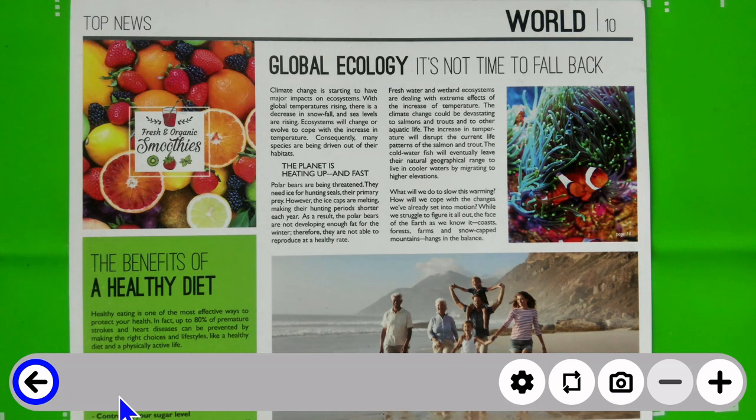Instead of doing that, I'm going to tap an arrow key on my keyboard just so that you can see things moving around on the screen via a keyboard. Again, another means of navigating items within the Prodigi interface. Let's tap it 4 more times. And you'll notice that it skipped over the minus sign there. That's because we are zoomed as far out as we can be right now. Our document is at 1x in a live viewing mode here.